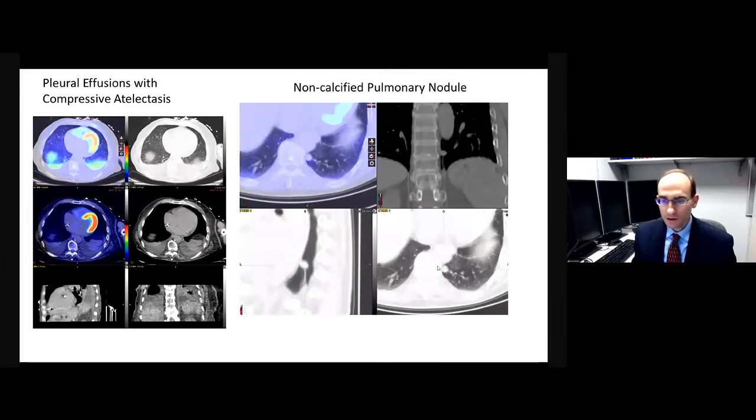It's important to look at the CT too, as it can tell you a little bit more about the nodules. This one's pretty round and doesn't have a lot of irregular edges to it, and those can be a little less concerning than, say, something that has more irregular edges.